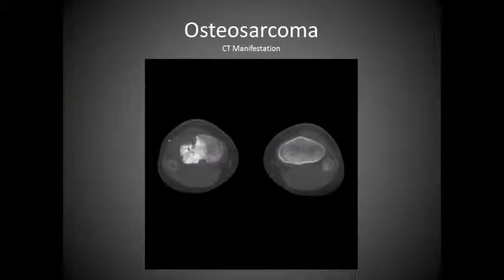So here we have the tibia, and notice that we have the fibula, tibia on both sides. So this is fibula, and this is tibia. Based on the size, we are probably at the tibial plateau or slightly below that. And so we're at the more proximal tibia.